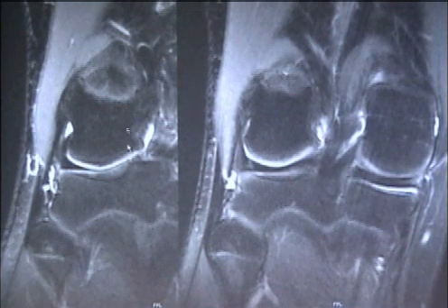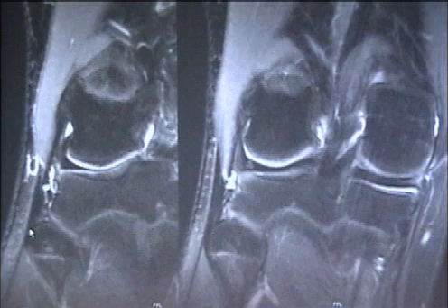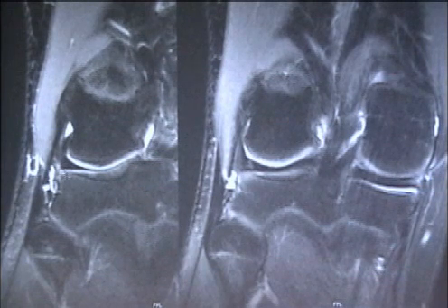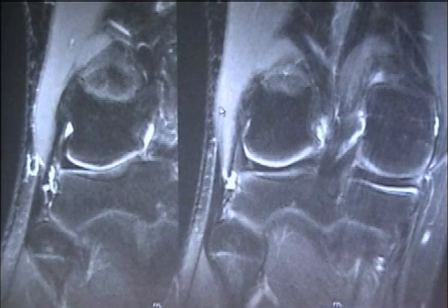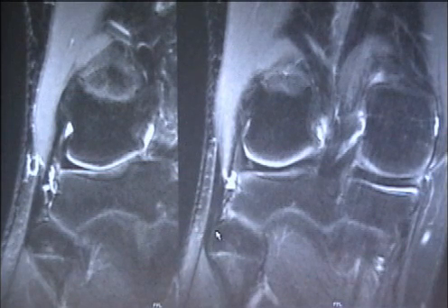Okay, so here we see this structure here very nicely. This is the fibular collateral ligament coming from the lateral femoral condyle, inserting on the fibular head. Here we see it there. And then this is the biceps femoris tendon. Here we see it. We're not seeing the whole thing. This is the muscle coming into tendon. And note that they're kind of coming together. They come together and form what's known as the conjoined tendon.